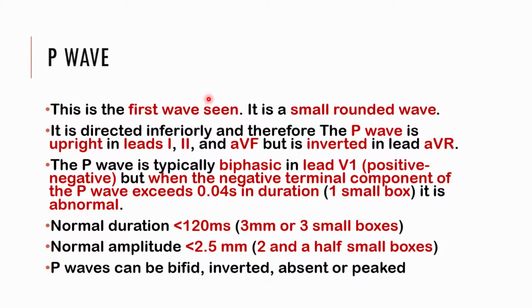So now let's go into details of each of the waves, and I give you the basics and what is very common on each wave, what is considered normal on each wave and on each important segment. And then in the next lecture video, which is the most important video of these series, is learning now the systematic approach that you take in interpreting the ECG.